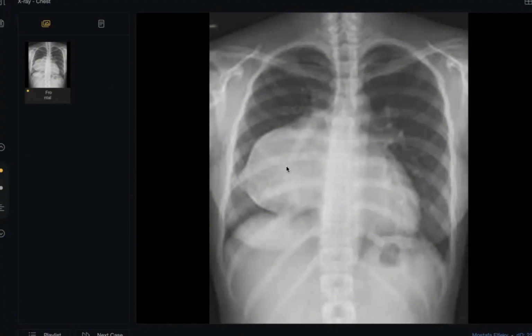What does it indicate? It indicates that it may be anterior or posterior. What about the paravertebral stripe? The paravertebral stripe is seen clearly, so it's more likely to be anterior. Look here at the periphery. Could you detect anything? Yes, the periphery of the lesion appears somewhat calcified or high density and lobulated. Give me some differentials.